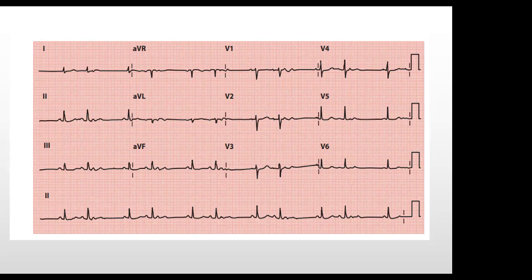Yes, the second beat looks like an ectopic atrial beat, and then the compensatory pause, and then a normal beat, an ectopic beat.